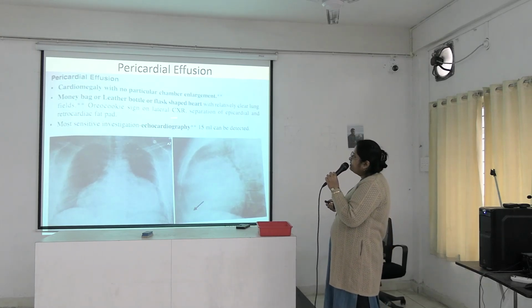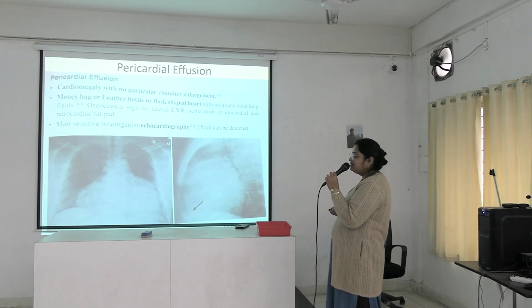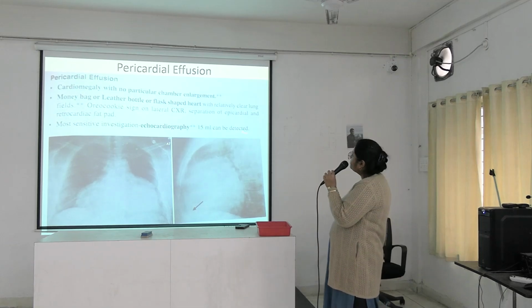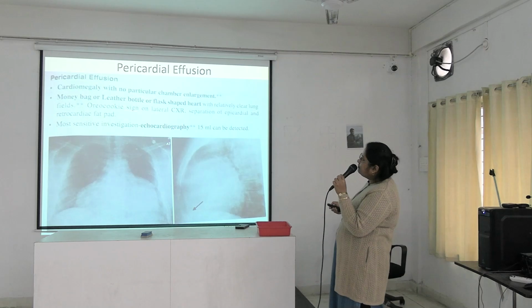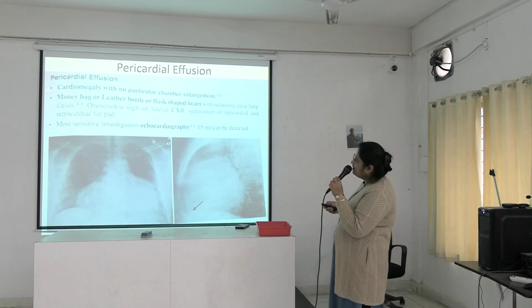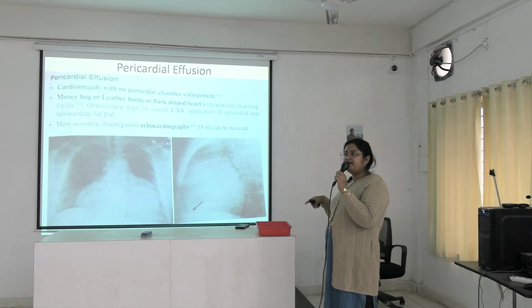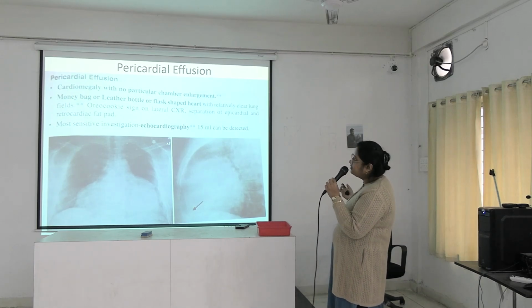Oreo cookie sign on lateral chest X-ray. This represents the cream, and on the two sides are the cookies. So this term is important. Leather bottle heart or flask shaped heart, money bag heart is seen in pericardial effusion. These are important for your MCQs.